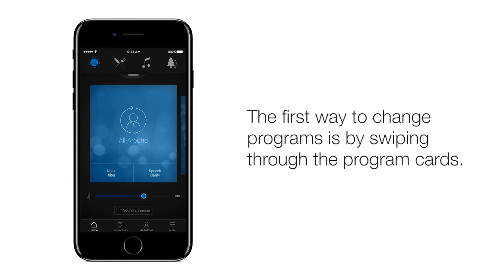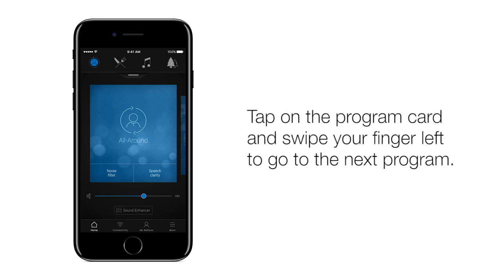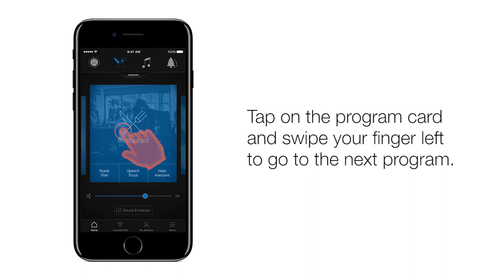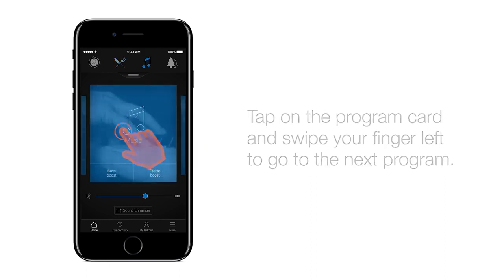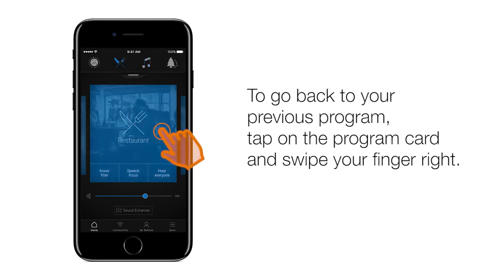The first way to change programs is by swiping through the program cards. Tap on the program card and swipe your finger left to go to the next program. A finger taps the right side of the screen and swipes left. To go back to your previous program, tap on the program card and swipe your finger right. A finger swipes right and the screen image changes.